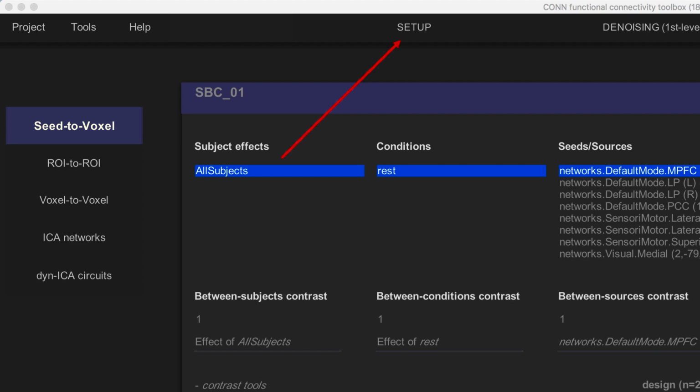So once you pre-process everything, get to the second level tab, and you go, actually, there was a group comparison I wanted to do. Don't worry, all you need to do is make a couple of changes to setup, and you'll be fine. People have made this mistake before where they then think, oh crap, I've got to rerun everything. That's not true. However, if you do want to denoise a particular regressor that you forgot before, you would need to rerun everything. So make sure that that is all set up before you do any of these group inferences.